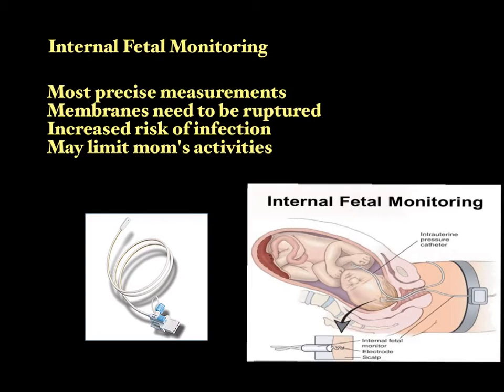Let me just show you real quick that port I was talking about. See that little port right there? That is where you would hook up an amnio infusion. So it's just one more advantage to having that.